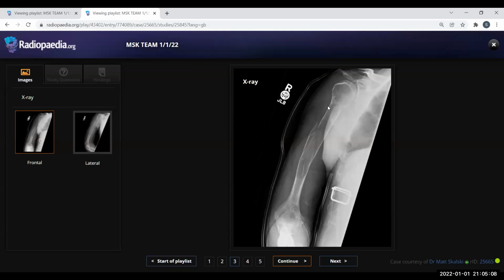Can you show me the soft tissue component? I guess this is the soft tissue. What do you mean by the soft tissue component here? I guess this is an aggressive lesion that is associated with a soft tissue component. So you think this is an aggressive lesion? My first differential would be a non-aggressive lesion, but seeing the whole view of the lesion, I think it's aggressive, and mostly it presents like a metastasis to me.